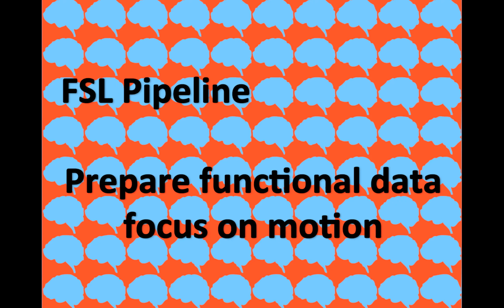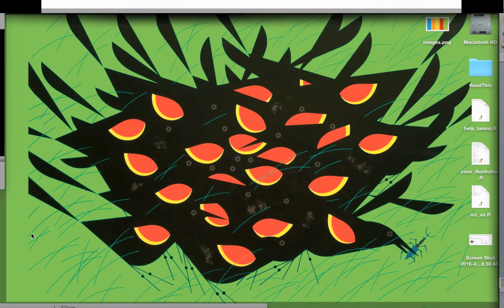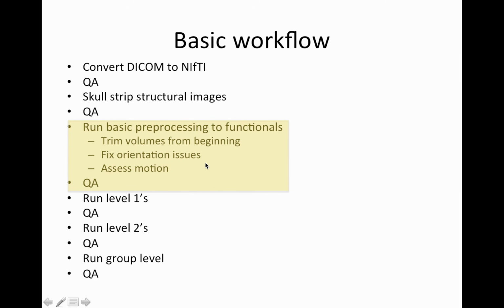Hi, so moving along down the FSL pipeline, we today are going to focus on getting our functional data prepared. So far you should already have your structural data all set, and you should have already had a peek at your functional data to see how they looked. So we're right here in the pipeline.